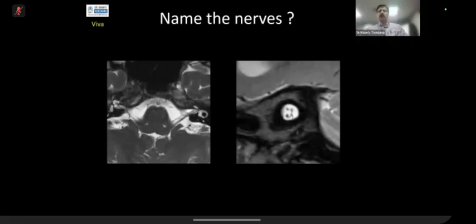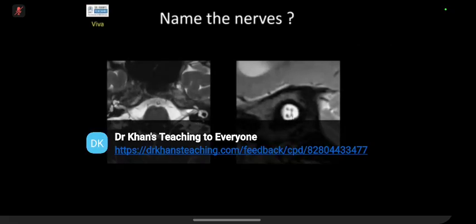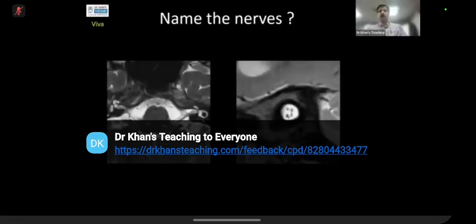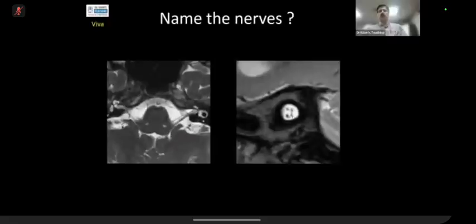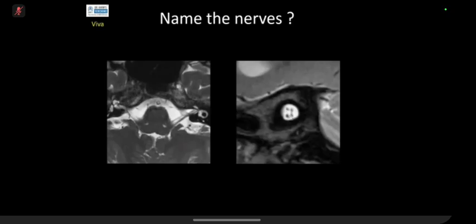Okay, so what is this nerve? That's the 8th nerve. Which nerve? Name the nerve. Vestibulocochlear nerve. No, my question is, you see, this is the lateral most portion, and you are seeing 4 nerves. Which one is this? Vestibular nerve.